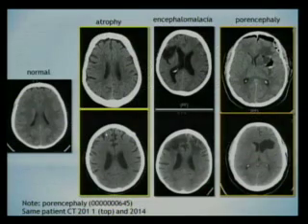Just a few words about atrophy, encephalomalacia, and porencephaly. Normal is something like this. This is a young person, obviously. The gray-white differentiation is still excellent. You see a few sulci, but they are mainly frontal. And according to one of my professors, the reason the frontal area prefers to be atrophic is because half the time we are asleep on our backs. So, the brain sags and the frontal lobes become atrophic. At any rate.